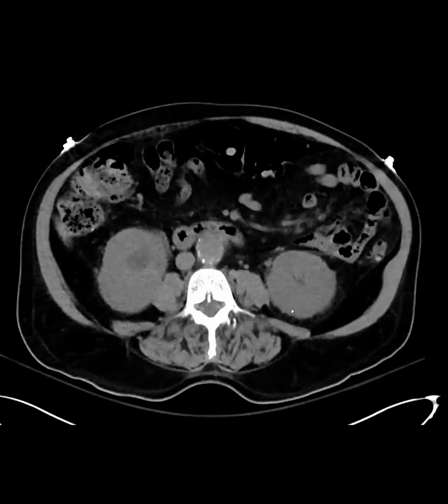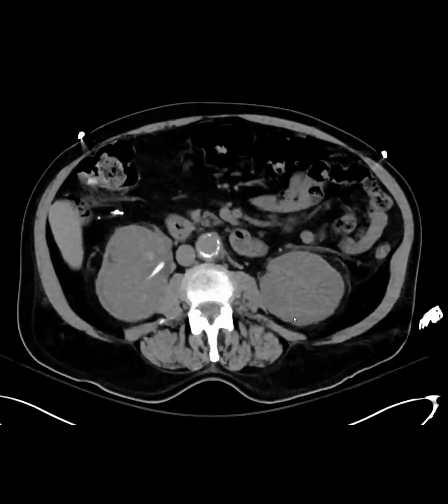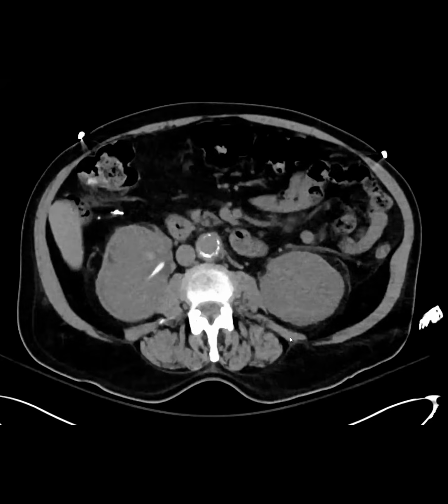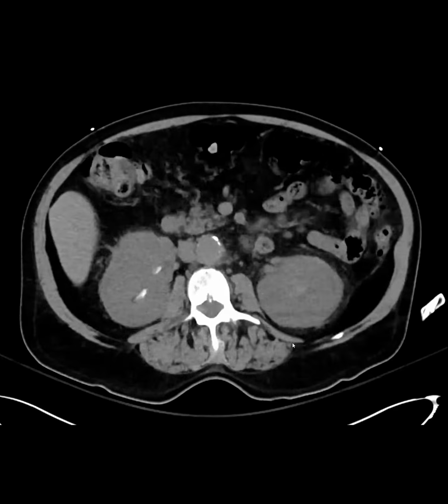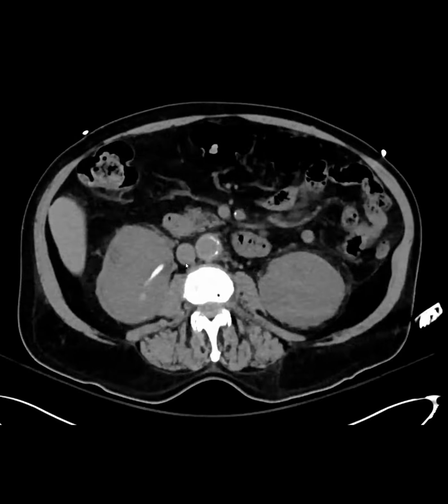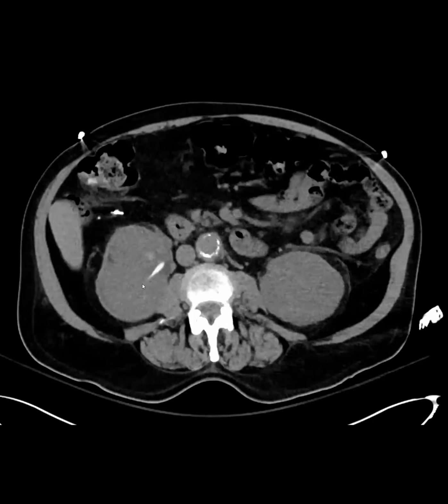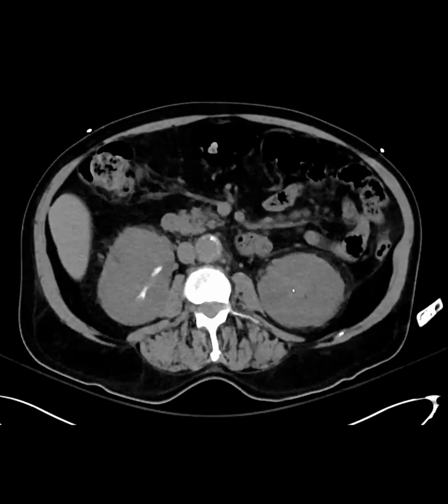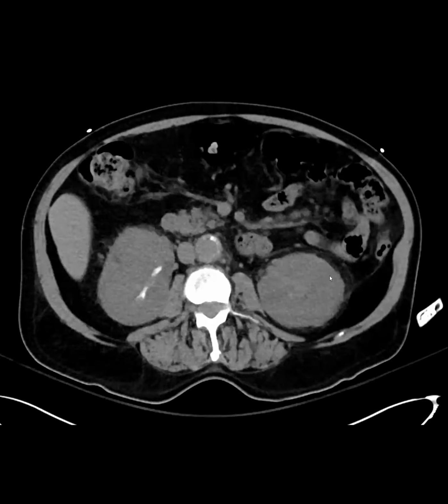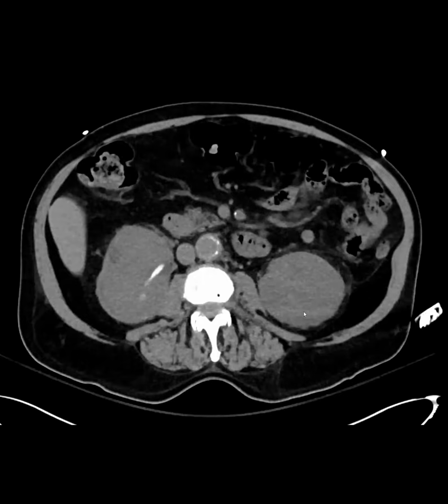Can we check the vessels, look for clots somewhere? This is a non-contrast, that's all we have. But sometimes you can get expansion of the vessels. For example, renal vein thrombosis bilaterally would be a little weird, but if the IVC was thrombosed, that could lead to this super edematous appearance where you don't see any of the fat. And the aorta looks funny. There's a lot of stranding just around the aorta. One more thing about the kidney: this is also a faceless kidney appearance. That's what we call it when the kidney loses its fat.